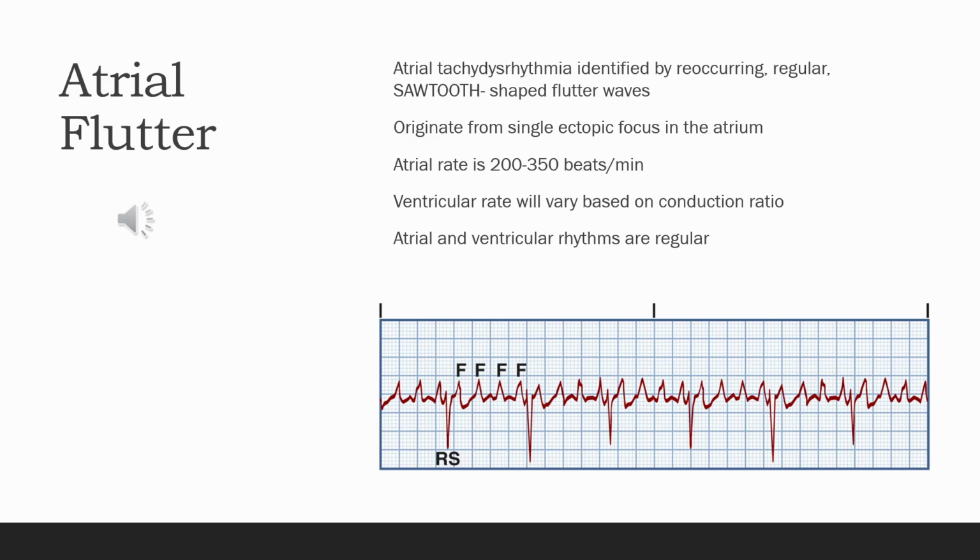So there are some cases where the impulses do get through, which leads to a really fast heart rhythm, but we're going to talk about that more with atrial fibrillation. Let's talk about how we can identify atrial flutter on an ECG. First, again, we look at that heart rate as always. We can count those R to R intervals, R waves within that 6-second strip. So we've got 1, 2, 3, 4, 5, 6 on that strip there. So we know that that's a normal heart rate.